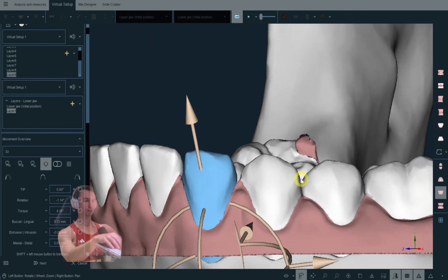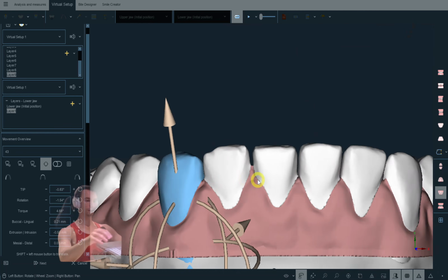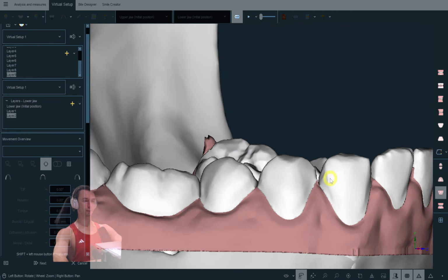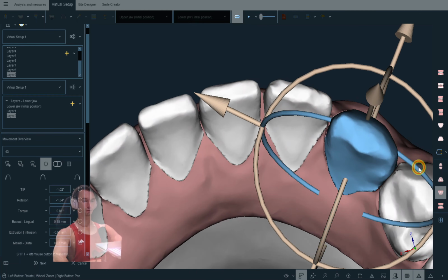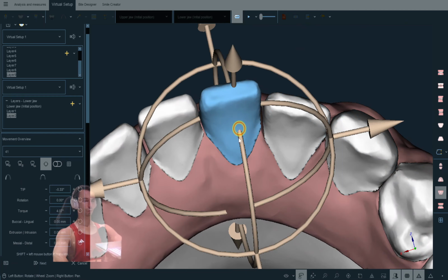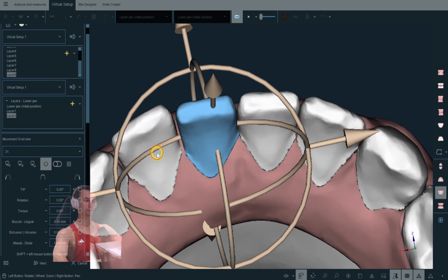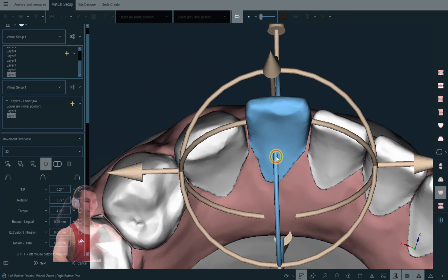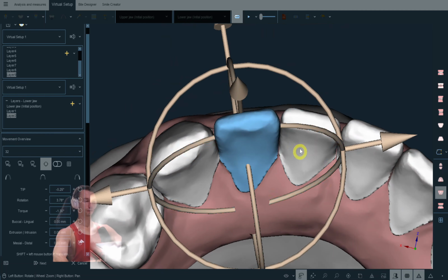And in the second layer, we will work with the incisors, because we also need anchorage for intrusion. We'll put 4 attachments on every premolar, put an attachment to make this anchorage, and do something else I'll show you later.